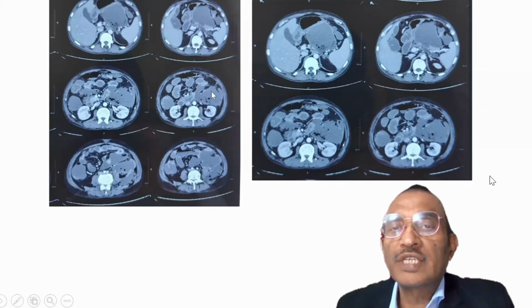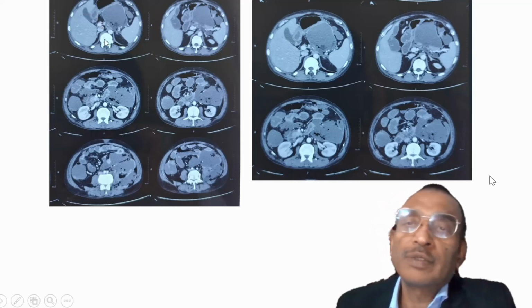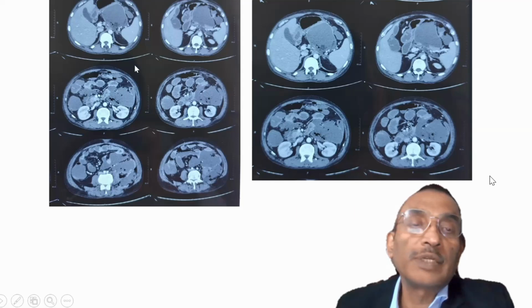Here also you are seeing extra vessels. Here also multiple vessels. Here multiple vessels. So possibly portal hypertension, and here you are able to see the SMV, and subsequently possibly the portal vein also we will see. So possibly thrombosis only.